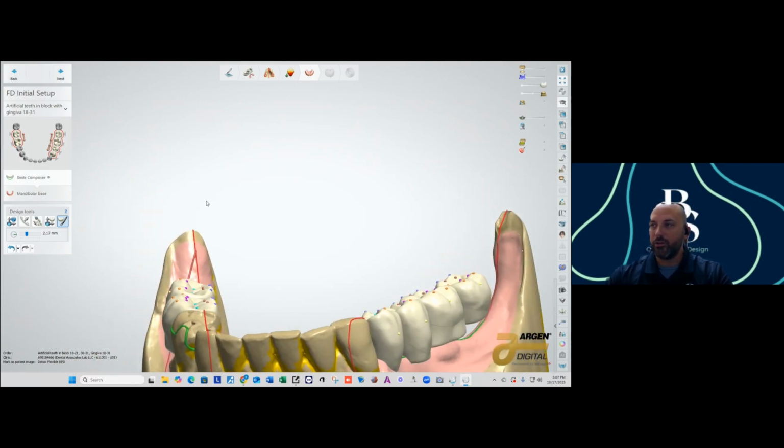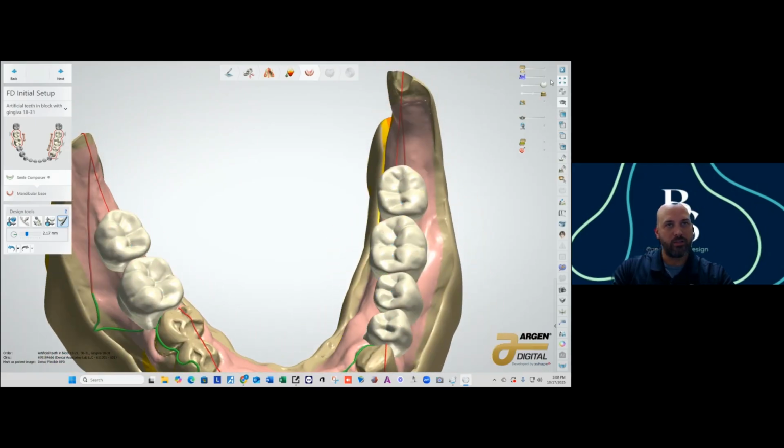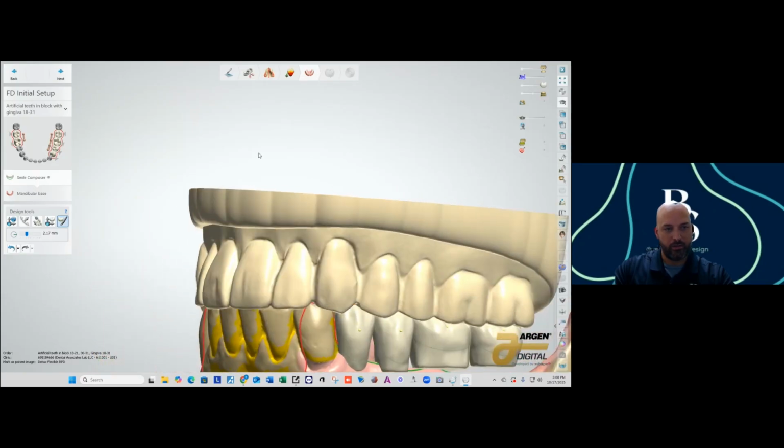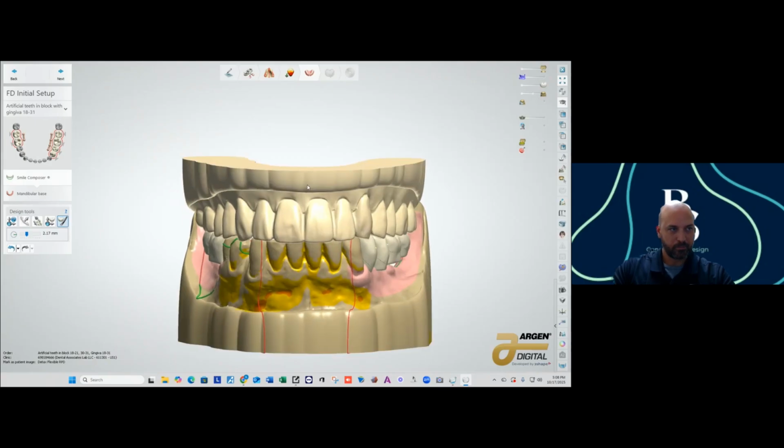When you do traditional dentures or traditional partials, to get those teeth to really occlude well, you have to grind down the occlusion a little bit, especially in the cusp areas, and then you end up with a lot of these flat spots. With these, they don't even look like they're touched, but we have really pretty close occlusal relationships here without being super heavy.